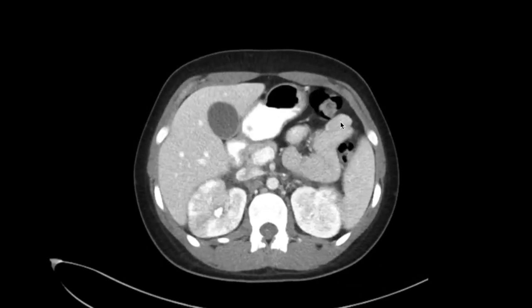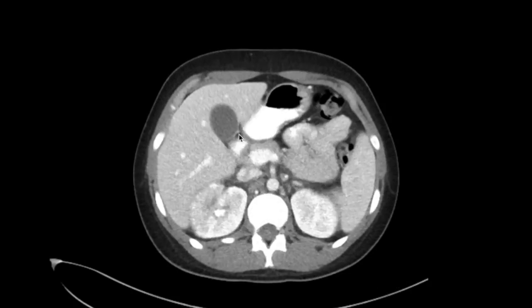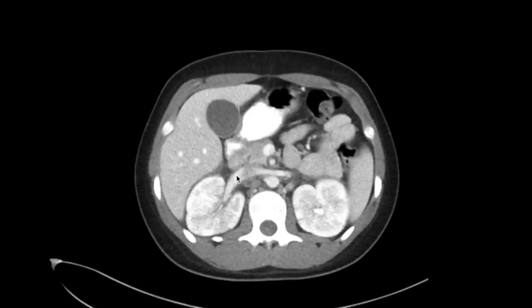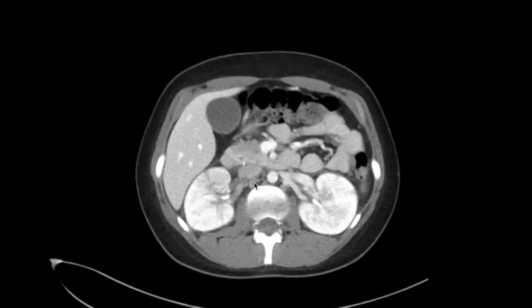The stomach connects directly to the start of the duodenum. This here is the duodenal cap and the first portion of the duodenum. There are 4 parts to the duodenum. The second portion of the duodenum here runs along the right aspect of the pancreatic head.